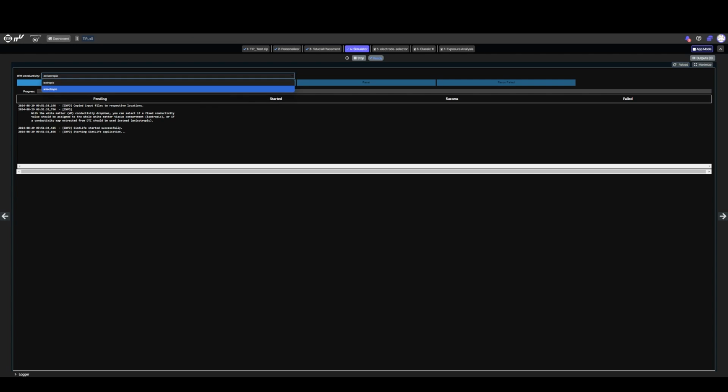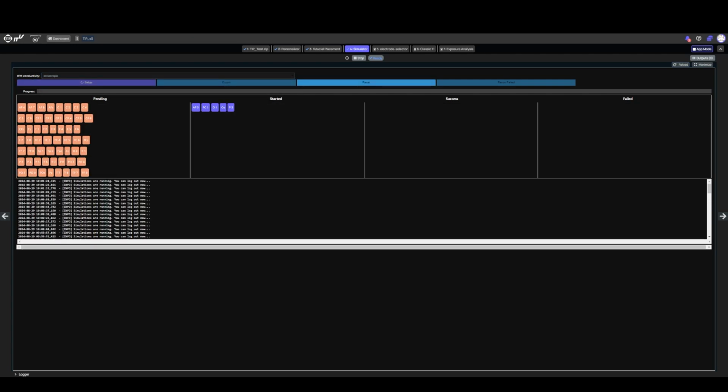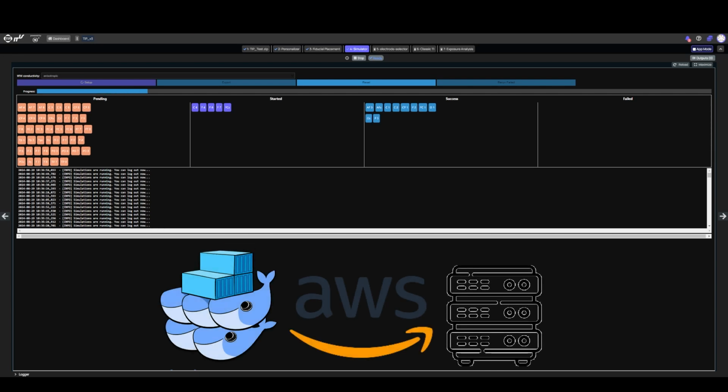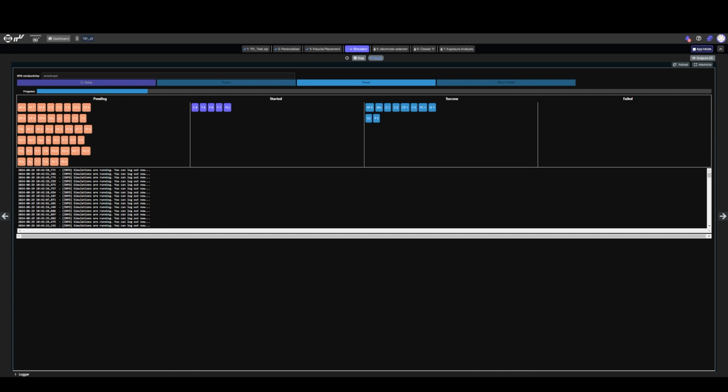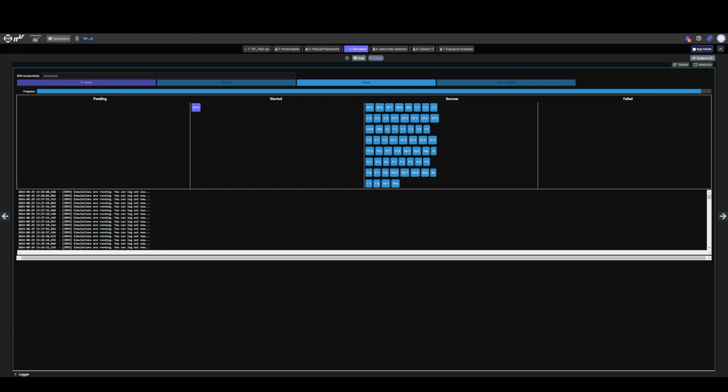In the next step, low-frequency electromagnetic stimulations for all the individual electrodes are set up and executed. Here, the newly accessible scalable AWS resources offer precious parallelization. The resulting field library forms the basis for the stimulation parameter assessment and optimization in later steps.